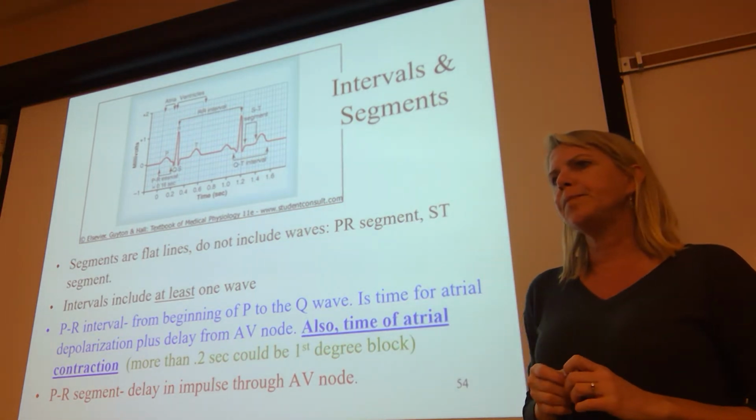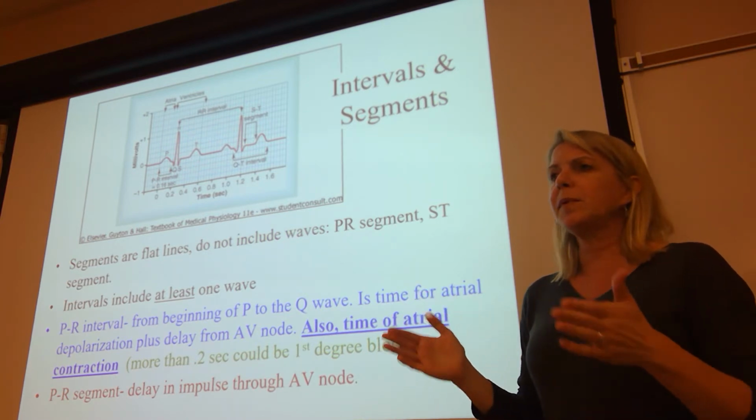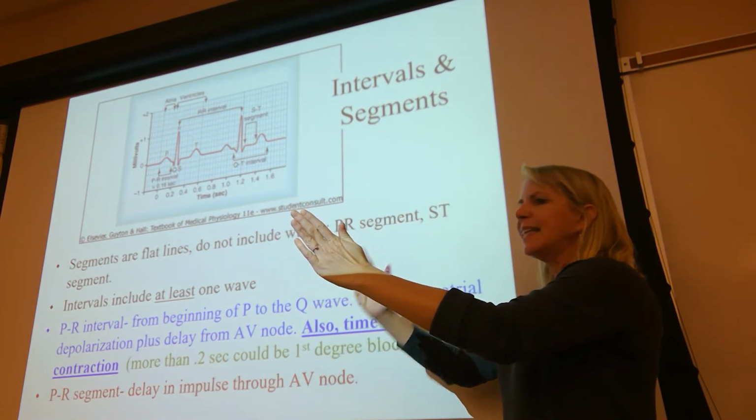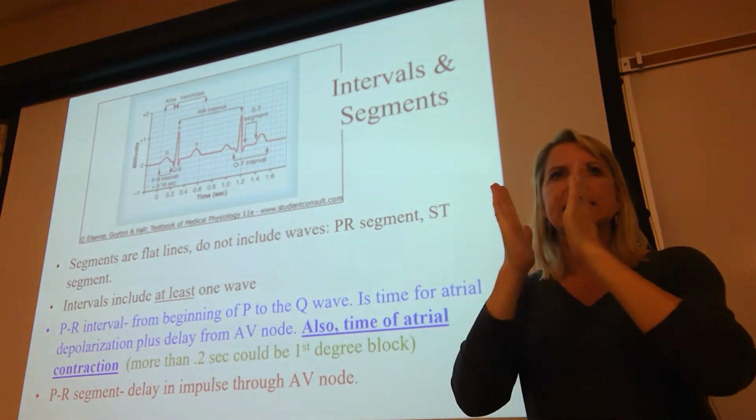Yes? It's just between the T and the P. Correct. Segments. Where else? The TP segment is between the T till the beginning of the next P. Segments are flat lines.